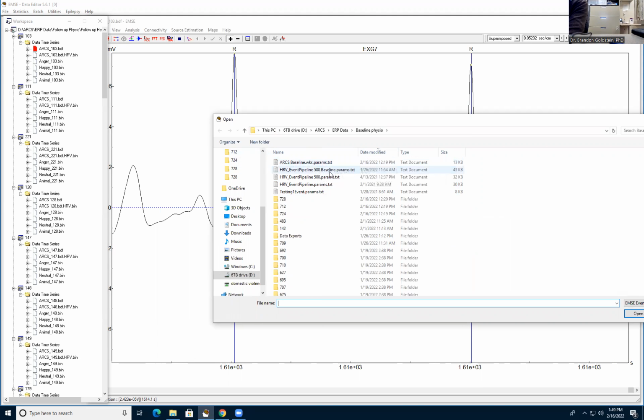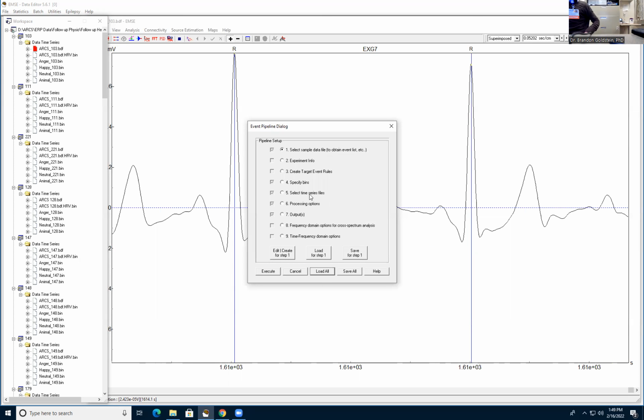So I believe it's this one. For the purposes of this, though, I am going to go into it in a little bit greater detail just to show you what's going on in each of these.